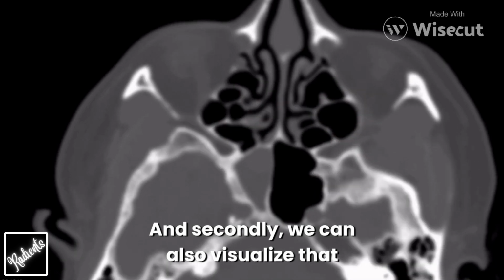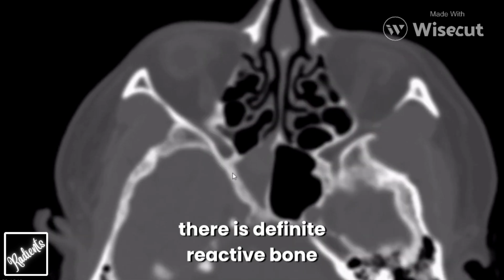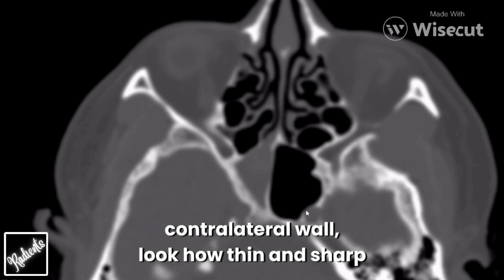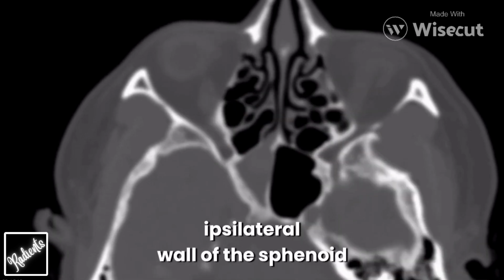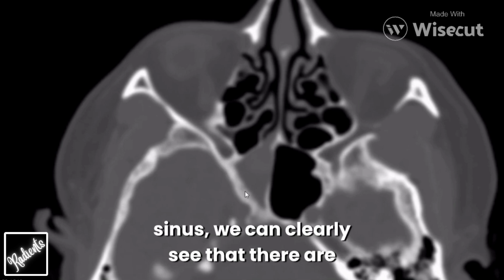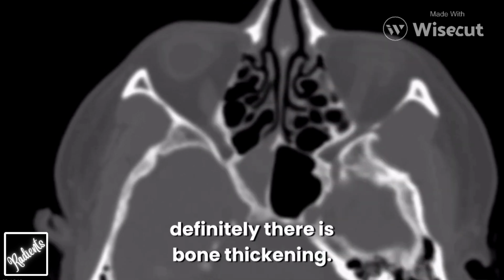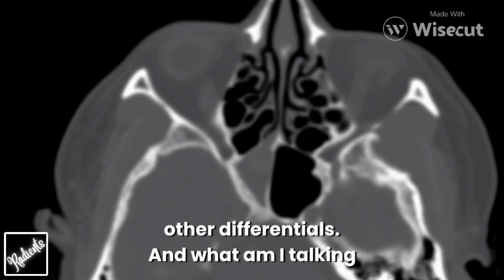And secondly, we can also visualize that there is definite reactive bone thickening on the ipsilateral sphenoid sinus wall. If you look at the contralateral wall, look how thin and sharp this is. But if you look at the ipsilateral wall of the sphenoid sinus, we can clearly see that there are features of reactive bone thickening. You won't find any erosion, but yes, definitely there is bone thickening. So this also goes against some of our other differentials.